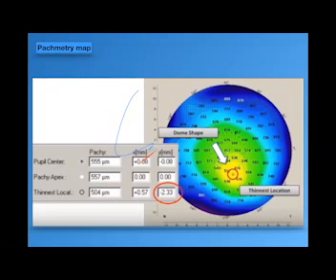Yesterday, I had a meeting with a lot of clinical cases and discussions about this issue, and the presenter showed identical twins. In one of them, we found that she has inferior steepening in her eye, which is more than the other eye, but both are in the same range.